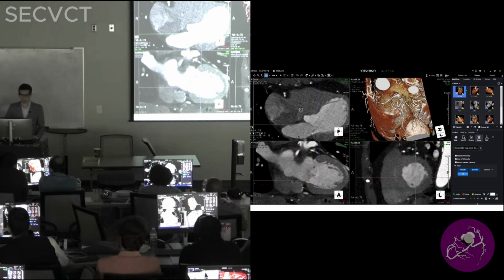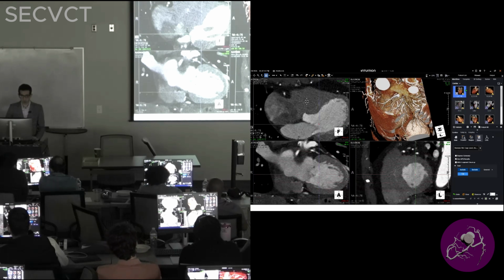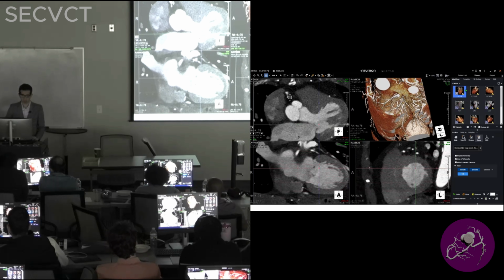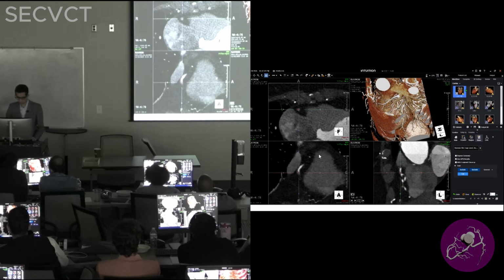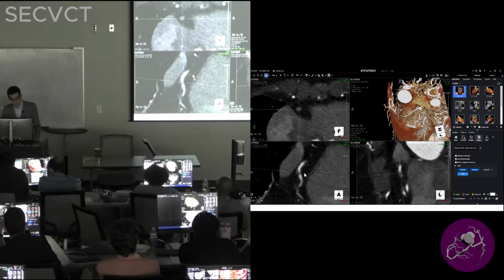Again, you can do the MPR or the CPR, but I'm just going to scroll from the top, just have that habit to screen arteries on the axial. So we scroll down and you start seeing some non-calcified plaques. Now we pay attention to the proximal to mid segment, and look at this here. There's a tightness. Is the artery just small or something off? So let's go there and carry our alt, the crosshair, and double oblique it there. How would you describe this lesion?